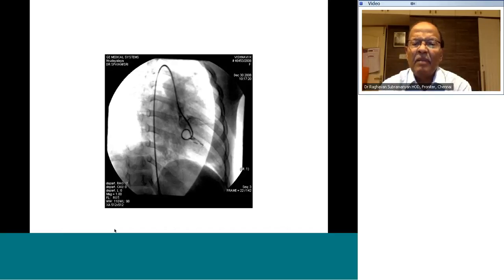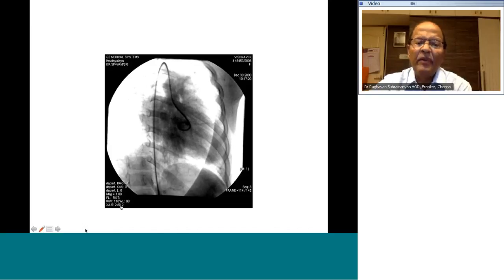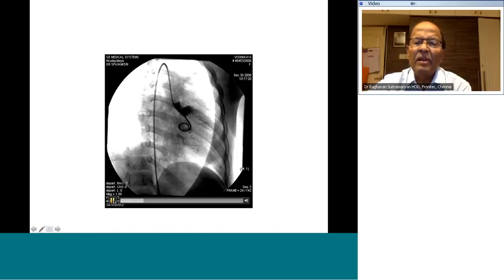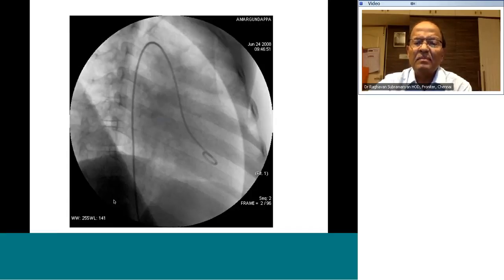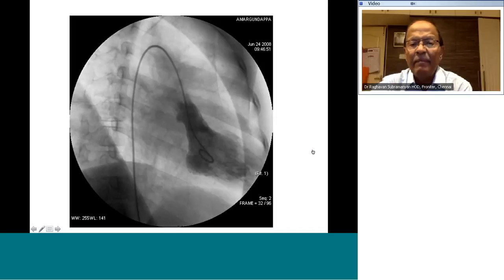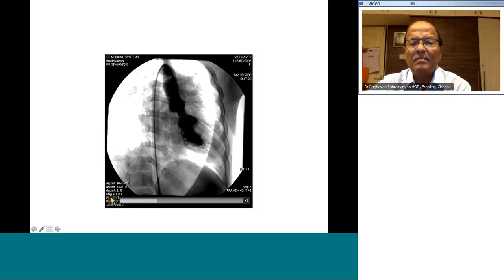Anybody would like to comment on that? I'll stop it for you. One frame I'll stop it in diastole, one frame I'll stop it in systole for you. Okay? I'm sorry, that went past. Okay, that's the systolic frame.